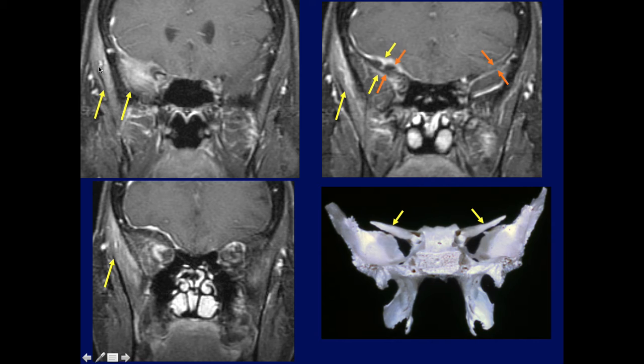What is enhancing here? What is this linear structure? Correct. As Gino says, the temporalis muscle usually will show abnormalities. I don't think it's tumor invasion, but just a reaction to the meningioma.